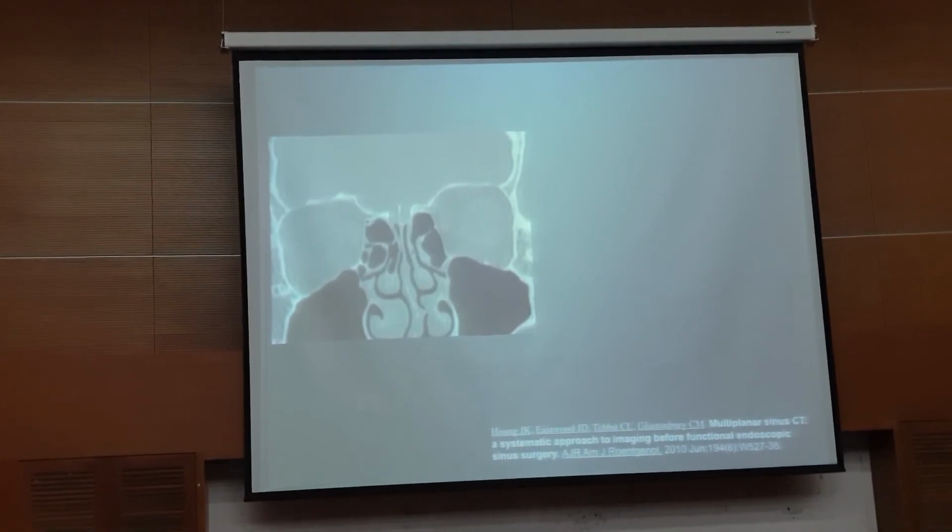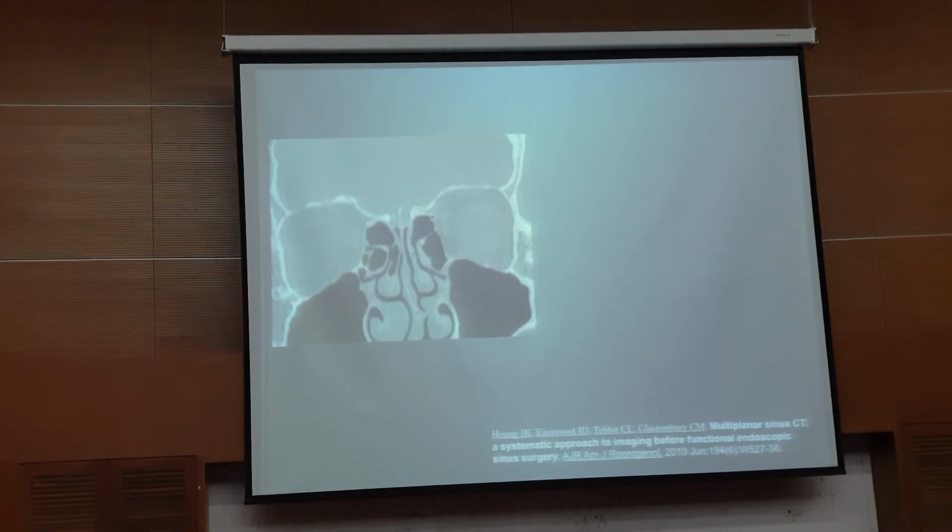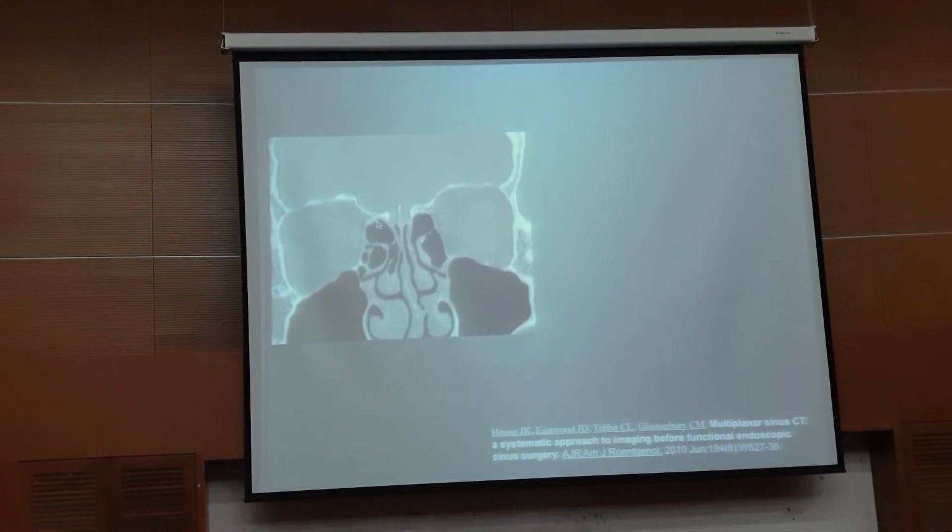So normally, on coronal view, the way that I look for the anterior ethmoidal canal is to look for the notch. Some people will call it the nipple, you can call it that if you want, but I call it the notch. When you scroll through the coronal view of the lamina papyracea, you should see bone all the time. But when you start to see a little absence of bone going into a notch, the canal, you know that you're at the area of the anterior ethmoidal canal. This is a surgical landmark, and normally it should be at the base of the skull, nicely there.